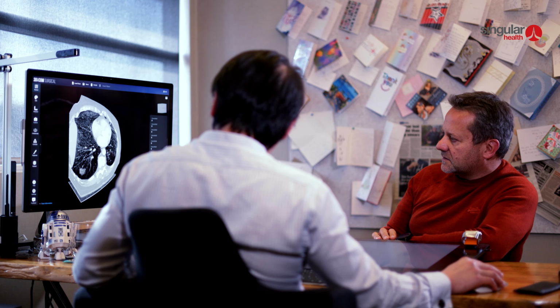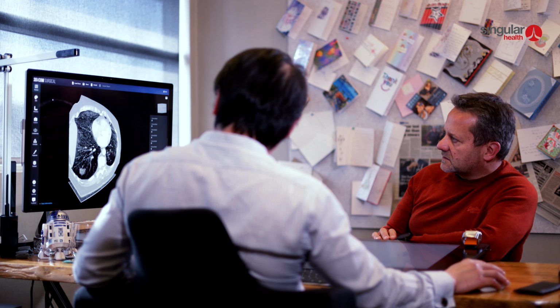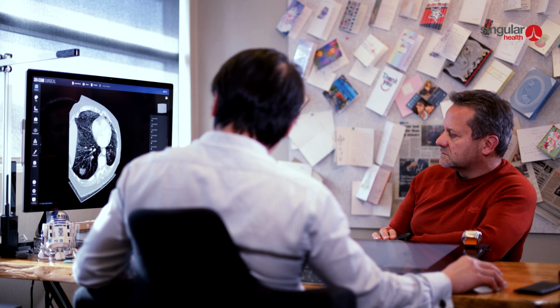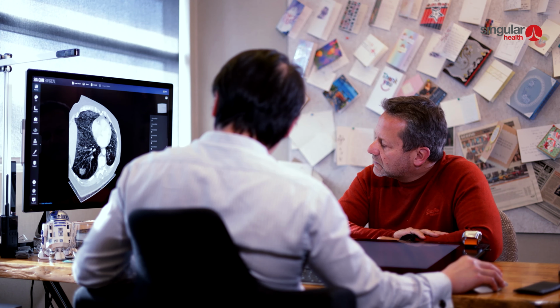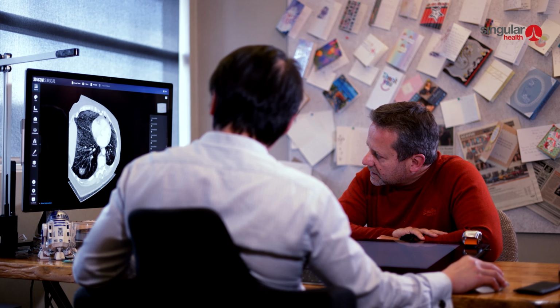Through there, yep, that's right, because that's the closest route, as you can see. Rather than going from here down to here, you can see that it's easier to go from here to here, through the rib, because that's soft tissue there. So they'll put a needle through there into the tumor to extract some cells.